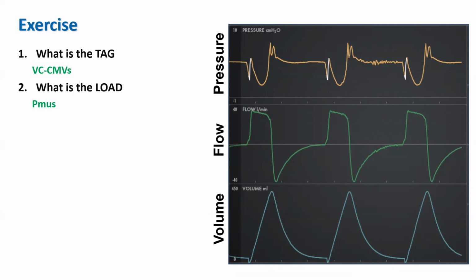Well, it should be pretty obvious that this is PMUS, this distortion, this pulling down of the pressure way below the baseline pressure. This is baseline pressure. This is inspiratory pressure. We would call this severe work shifting, right?